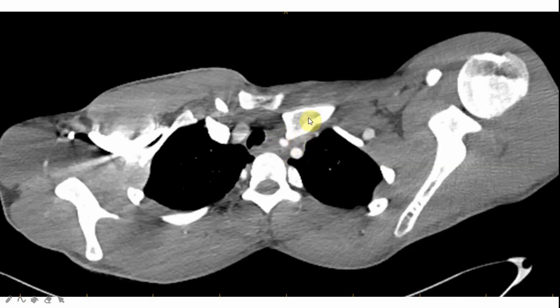This is very concerning because the bone looks quite smooth here. It's not sharp. It's not going to cause penetrating injury or puncture to the common carotid artery, but it can cause some bruises that we cannot see here, and this is a vascular cardiothoracic emergency. If we look at the rest of the scan, we can see that there is no obvious bony injury, although this is not a bony view.